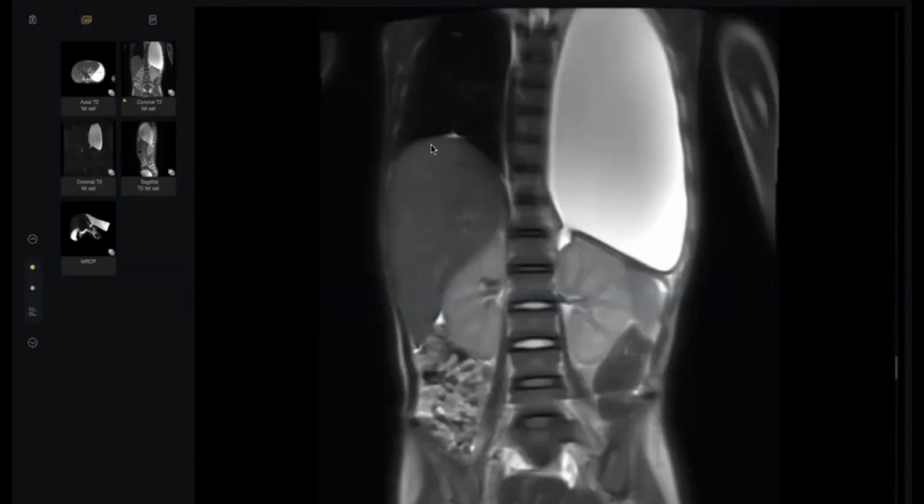Pancreatico-pleural fistula. Okay. How to confirm this fistula, doctor? We can give some contrast to this cavity, which may communicate within the effusion. We can do a fistulogram. What else?